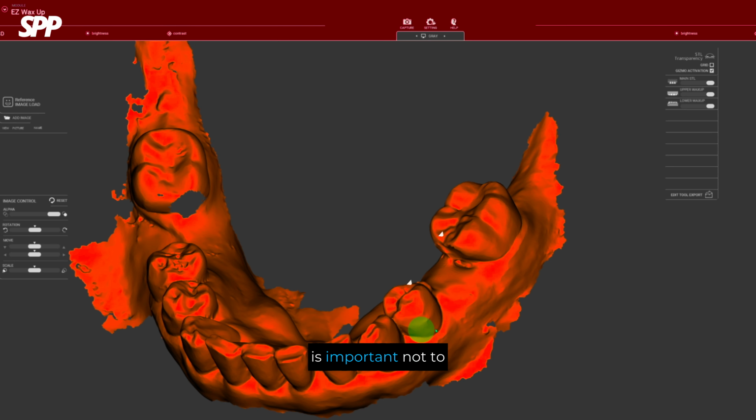I imported the DICOM file into the software. This software has a feature that reorganizes the value range based on Hounsfield units. It also includes a function called Digital Eye, which displays this information in color for easier visualization. After the reorganization process, I was able to review the DICOM data in a clean and clearly aligned format.